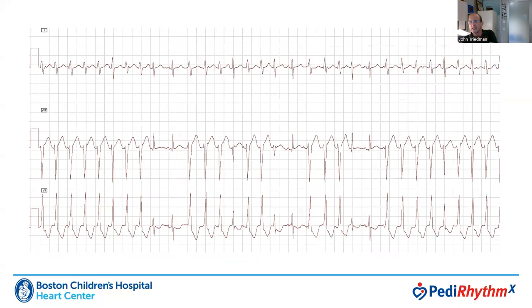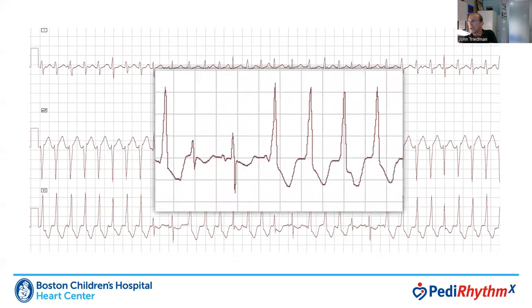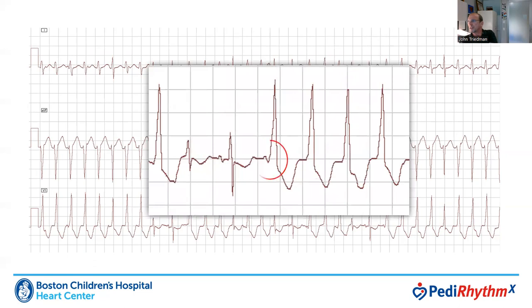One other little trick that we can use is looking at the onset of the tachycardia rhythms. And in particular, I'm just going to point to this very first beat right here. We have a P wave occurring in the capture beat before it, and we have a very clear P wave occurring here with a non-physiologically short PR interval afterwards, indicating that the QRS complex was not triggered by the P wave that you see there. So again, an example of ventricular tachycardia.